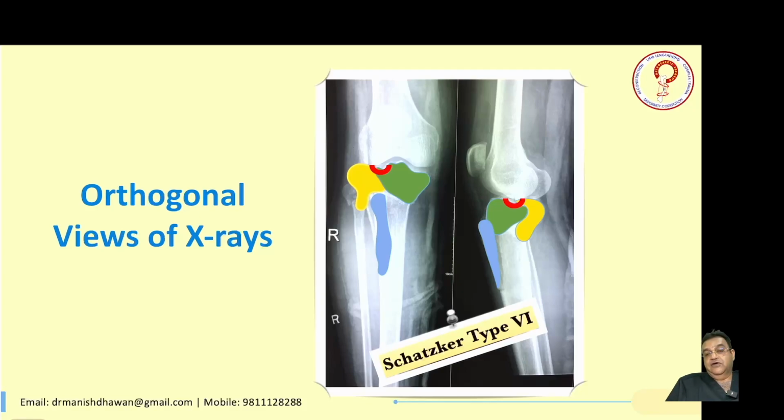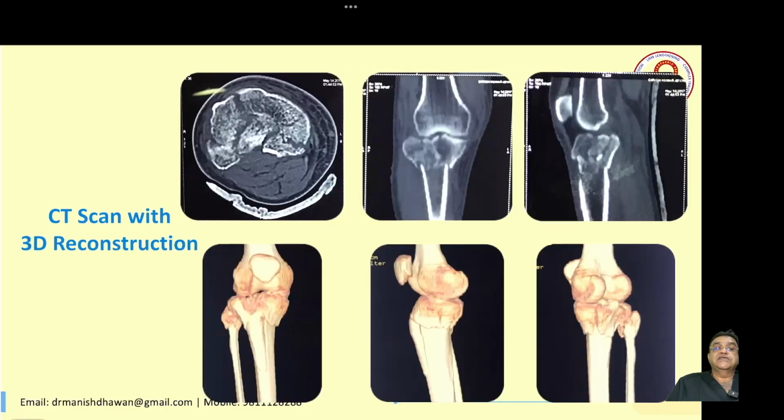The right choice for treatment in this case is an Ilizarov fixation. The CT scan will show multiple fragments. If you can see, there are many fragments and you can plan it. This is an axial view. See how many fragments are there. And 3-dimensionally you can also see from the back. Now you have to plan where you should place wires and the screws.